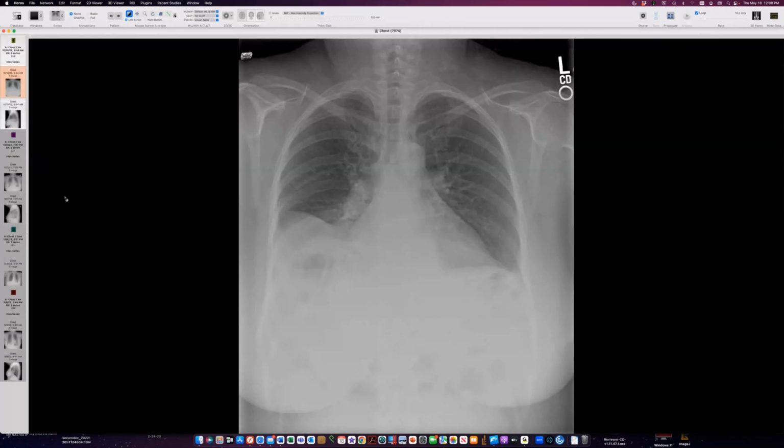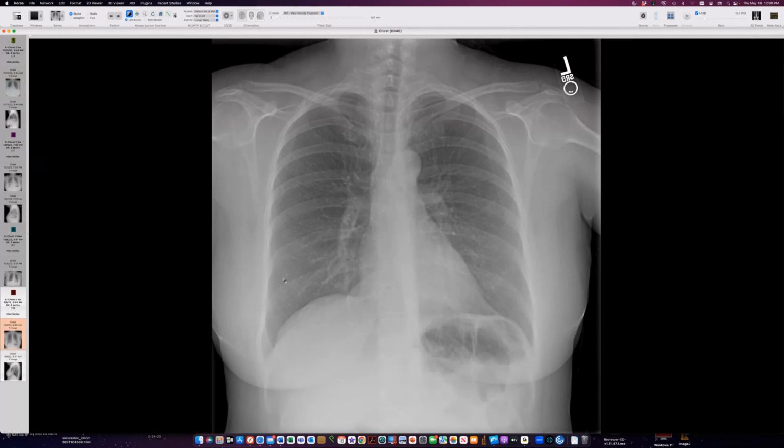Here we go. Okay, so this person had this radiograph at the time of screening for liver donation. So this is a living donor here, and the idea was to do a partial hepatectomy and then transplant that into a recipient. So he's kind of wondering, could there be a little more Morgagni hernia going on here, but a pretty normal contour of the right diaphragm out there.